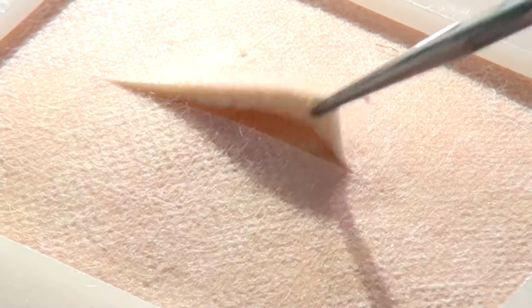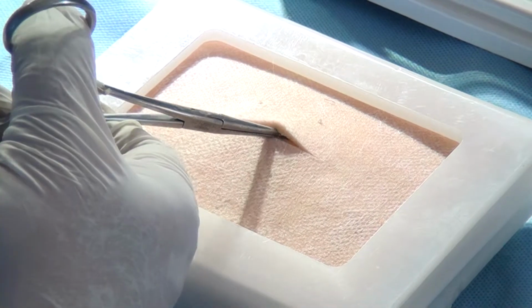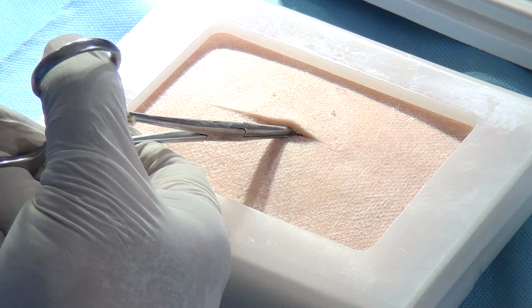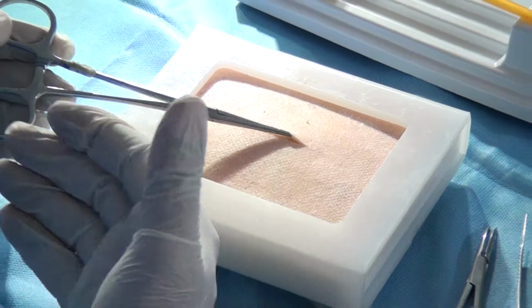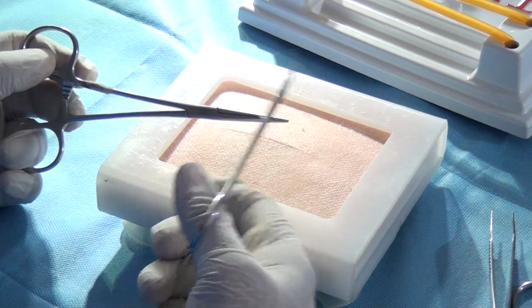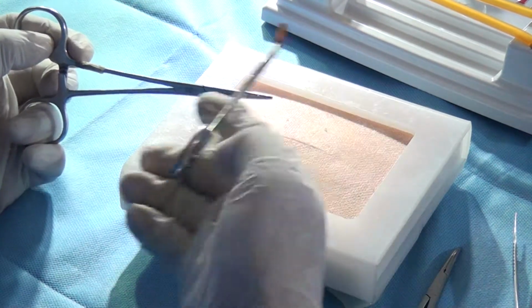With straight artery forceps, you have the advantage on the surface, but in the depth, you certainly cannot see the tip. You will be tying what you do not see. You're doing a hysterectomy and you tie the ureter. You're doing some other surgery, you tie something vital. So this becomes a problem. Therefore, see what you tie and tie what you see. Clear? Yes, sir. Now, depending upon the size, they are called medium, large, and mosquito forceps. This is a mosquito.